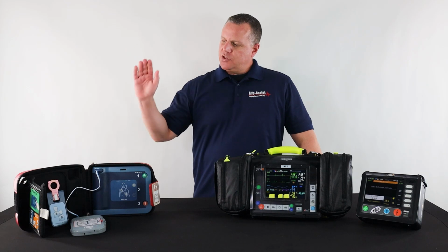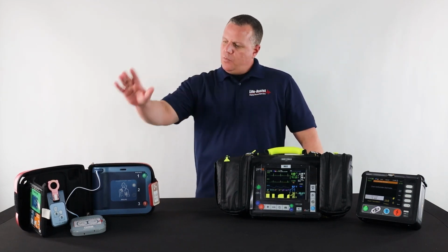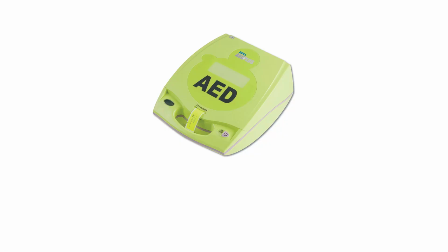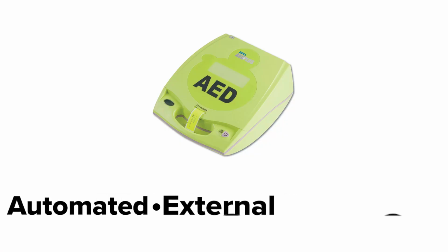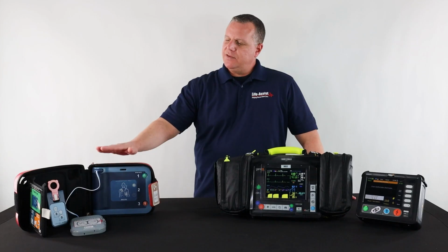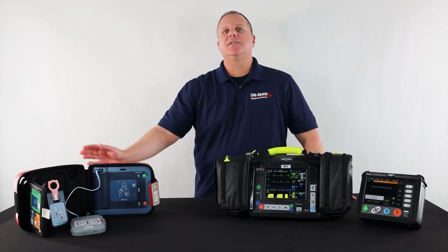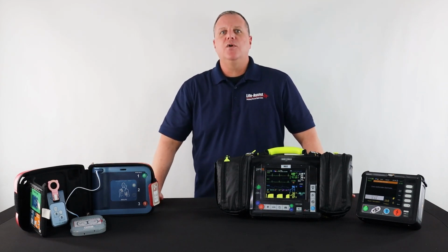Okay, gonna go ahead and start with AEDs. I got my AED here, got my cardiac monitor here. What does AED stand for? It stands for Automated External Defibrillator. Okay, what does that mean? Well, basically this means that this device treats people that are in sudden cardiac arrest with an electrical shock, okay?